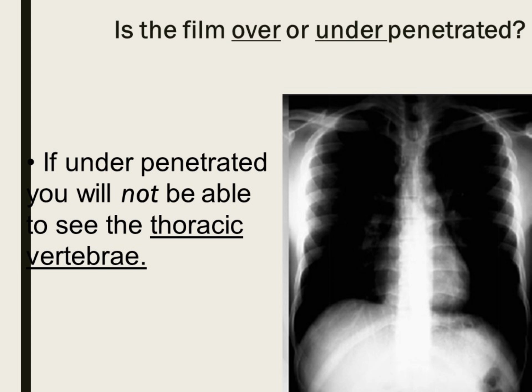Over or under penetrated? Well, kind of underish, but you know, it's not terrible actually. This is not bad. But if you again look at the spine, can you distinguish the vertebra separately from each other? It's a little hard.